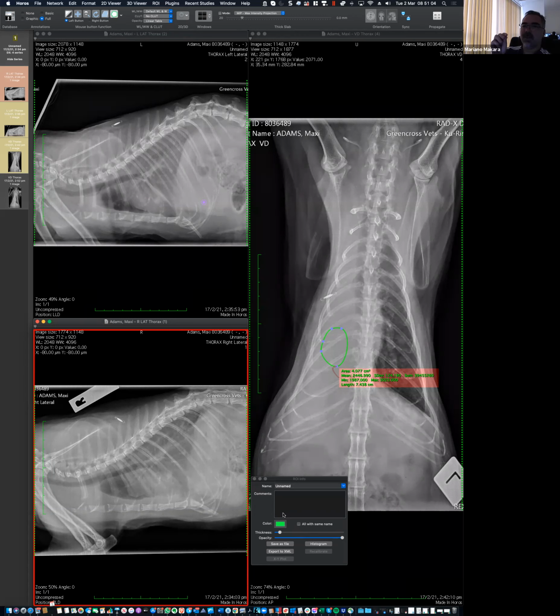And basically what happens is once you have that airway that is obstructed, then there can be areas of pneumonia as well, and even areas of granulomas. Makes sense? So the neoplasia obstructs the airway, and then there could be a superimposed infectious inflammatory process. So that fits. The comment that we still have, and should be considering now, is what if next time we are in this situation and we see something like this?